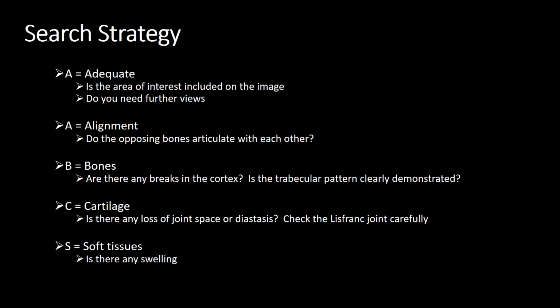So if the patient comes in and they've injured their tarsal bones, you will need to go and do that lateral view. A is alignment. Do the opposing bones articulate with each other, or has there been a dislocation or subluxation?